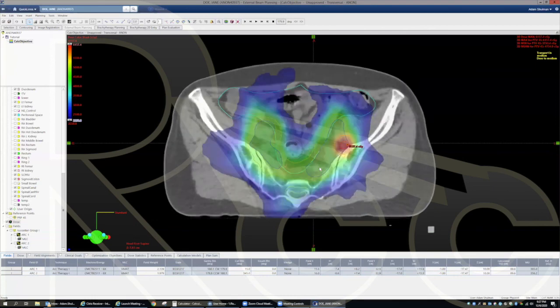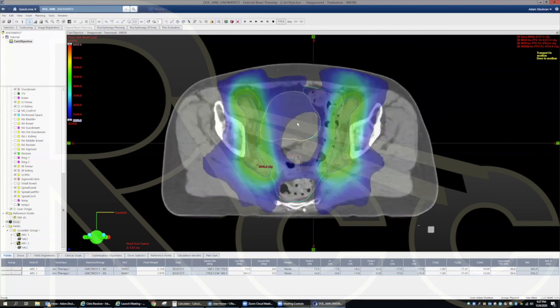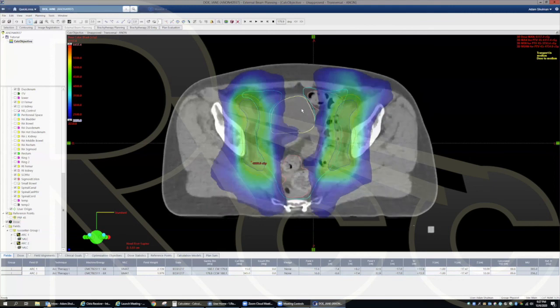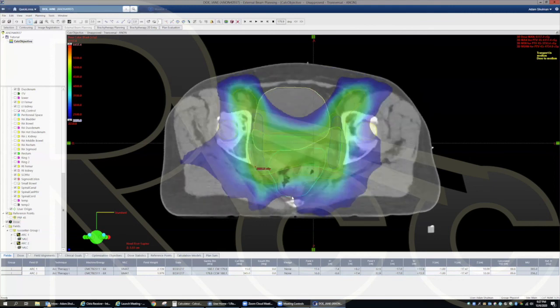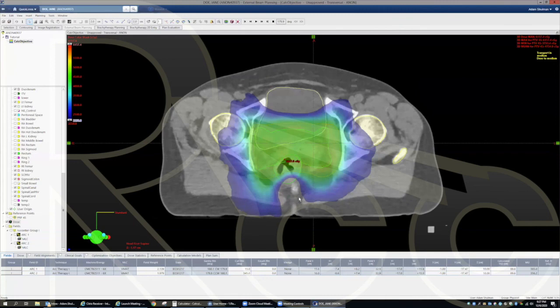You can see it dropping on the bowel, on the bladder, more bowel, around sigmoid. This is all 50%, which is pretty impressive for just 2 arcs. Here it is, bending around the rectum, around the bladder.